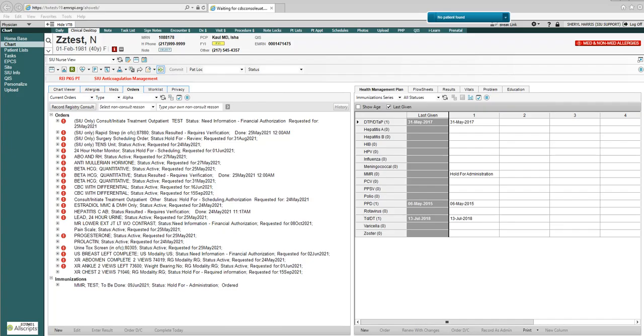I'm the Clinical Informatics Nurse Manager, and today we are going to discuss radiology guidelines for appropriate use criteria. This feature has been added to TouchWorks to meet the CMS, Centers for Medicare and Medicaid Services, requirements for consulting appropriate use criteria for advanced diagnostic imaging services. The radiology guidelines feature provides clinical decision support during the ordering process for imaging procedures.